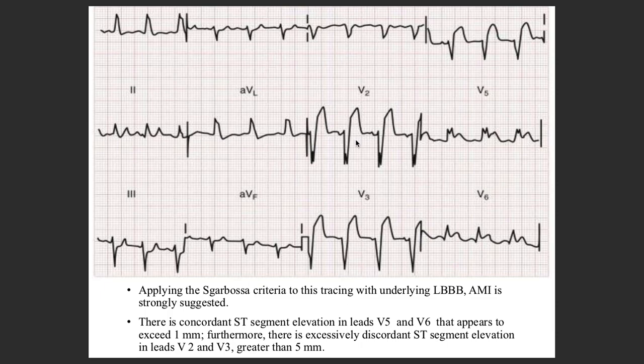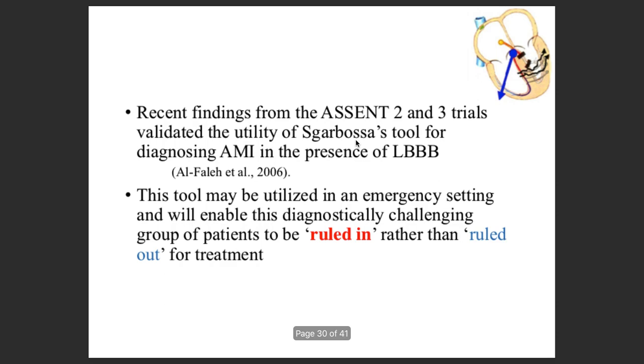Right. This is one of the reasons we shared the presentation, so you can always zoom in. Whenever in doubt, this is the benefit of digital ECGs, if you have them. You can zoom in, take your calipers, and put them up. You can see those markings, how regular or irregular it is. If anyone proposes a theorem, what about the validation? Is it valid? Is it good? So they try to see that as well.